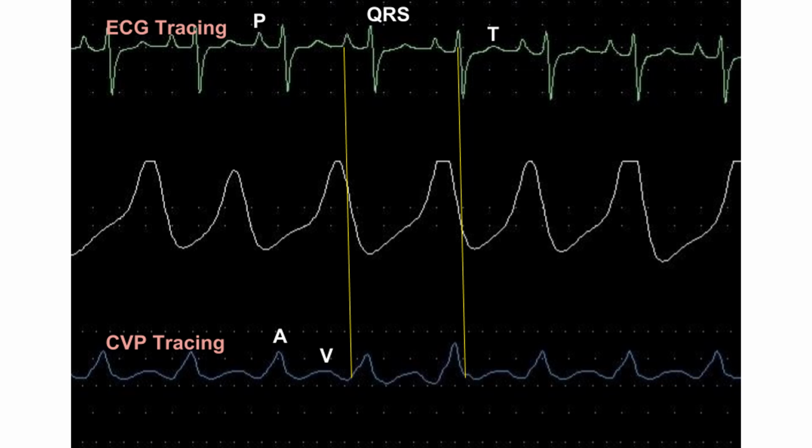A wave becomes prominent when the atrial contraction is more forceful, as in the case of ventricular hypertrophy with diastolic dysfunction, or when there is obstruction to the tricuspid valve. A prominent V wave, really a CV wave, occurs when the tricuspid valve is regurgitant, so that right ventricular blood is forced into the right atrium during ventricular systole. These prominent waves can also be visible clinically in the jugular venous pulse and are important diagnostic clues.